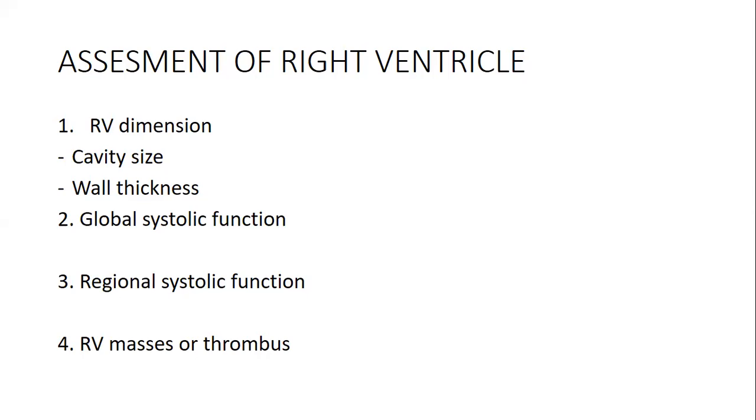Upon looking at this, you have to know the normal size. What is the normal size of the right ventricle? When do I measure? At what level do I measure?